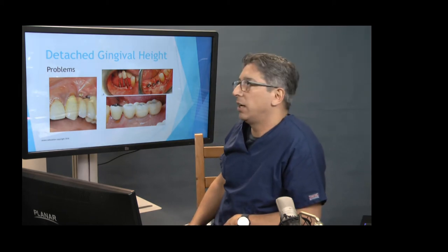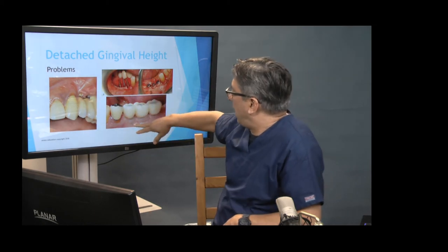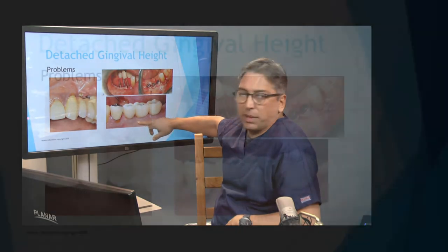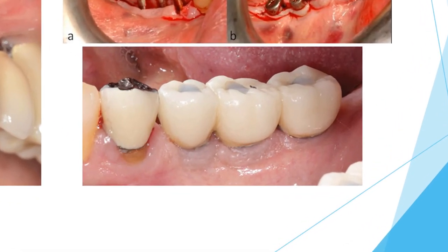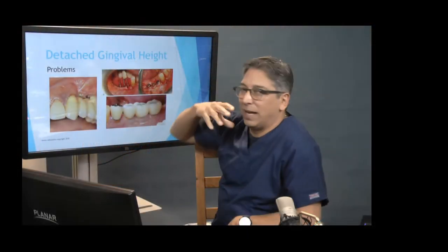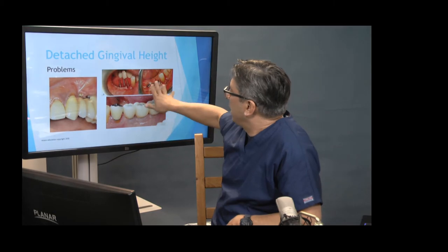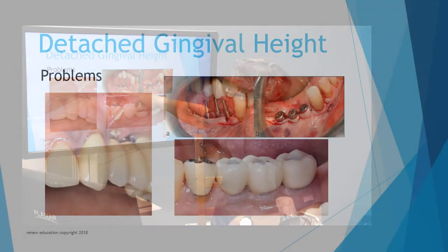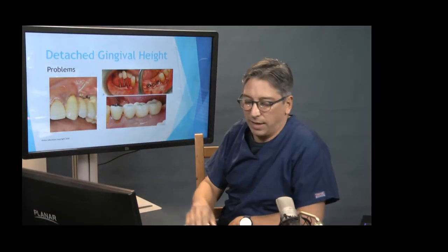Those are generally successful. Now here on the bottom you have 3 implant crowns here, and they have a little bit of attachment, but it looks like this was a grafted one where they thicken the tissue so it doesn't move around as much. So this would be a grafted version. Up here, this is not a grafted version, but you can see the attached tissue go way up high, and they're just going for it around on that tissue and letting that heal.